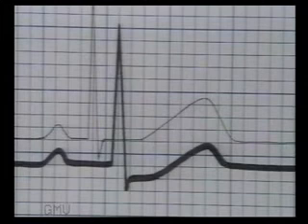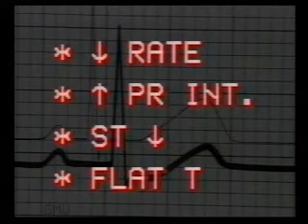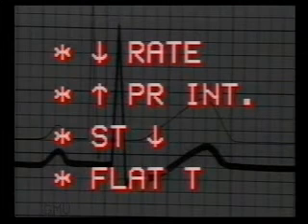The QRS complex is normal. The ST segment shows 1 mm depression and the T wave is upright but flattened. This is an effect of digitalization: slowing of heart rate, prolongation of PR interval, slight ST segment depression and reduced amplitude of the T wave.